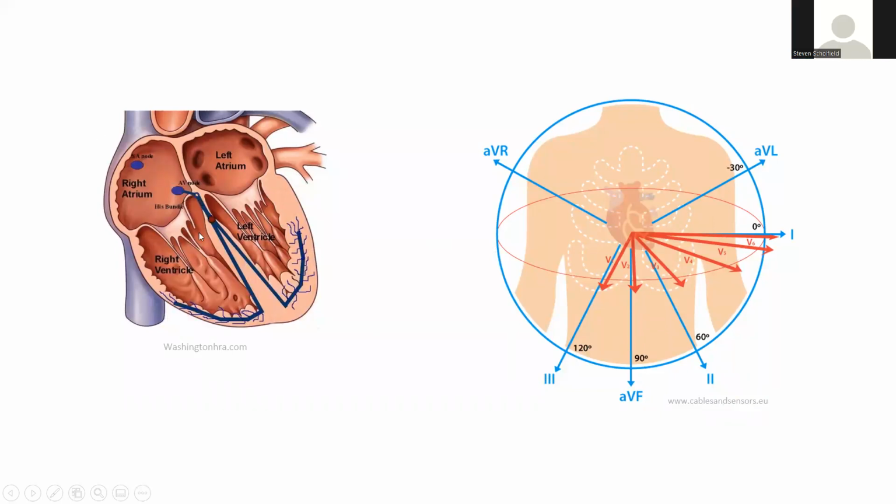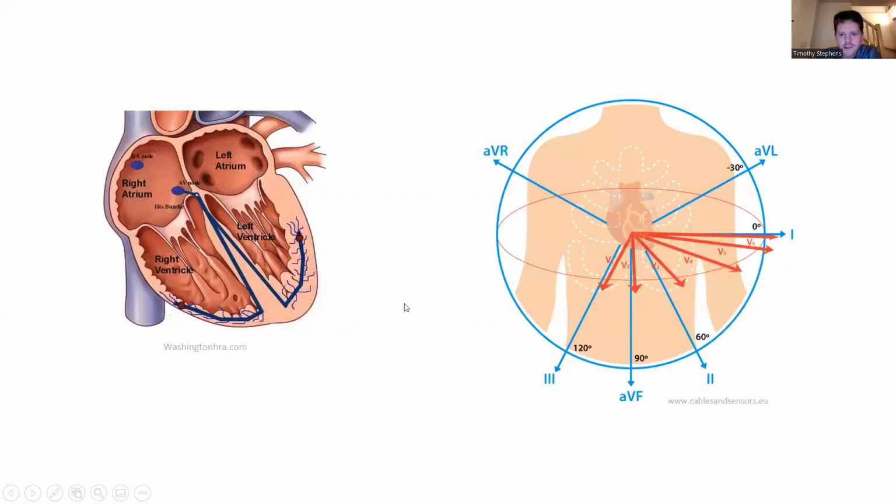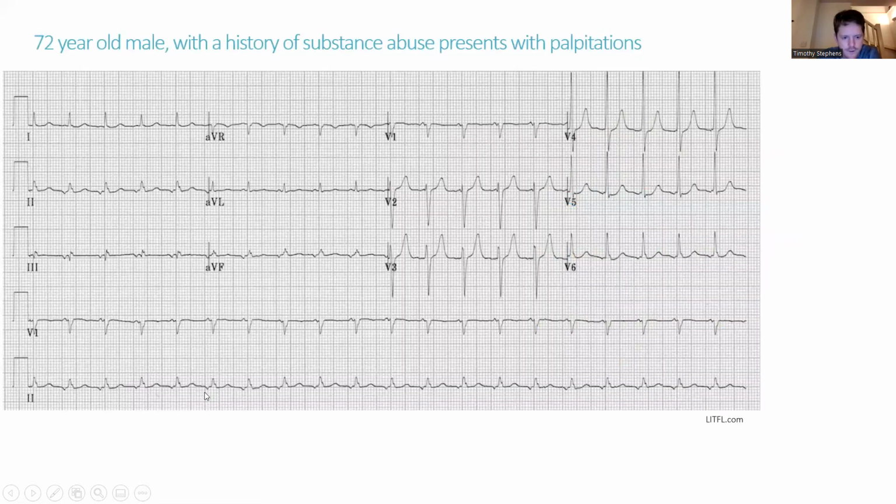Yeah, good, brilliant. It's moving this way. So it should be moving away from AVR, yeah? Which means that AVR for a sinus beat should be negative. But AVR has actually got these little positive bits here. It's got positive waves here. Similarly, in lead 2, it's moving down towards lead 2, so therefore it should be positive because it's moving towards that lead. It's going to be detected by this lead as a positive deflection. But when we look at lead 2, it's negative.